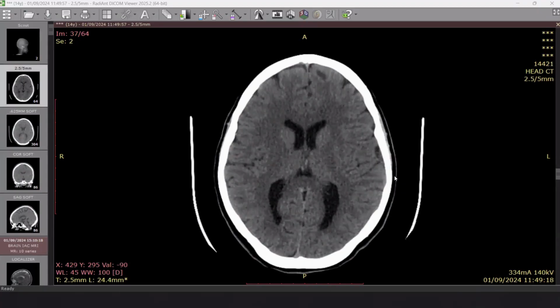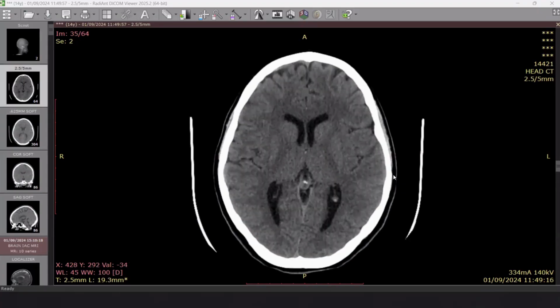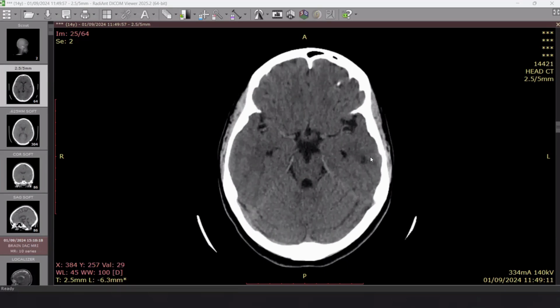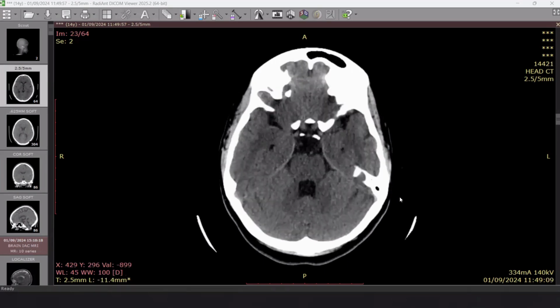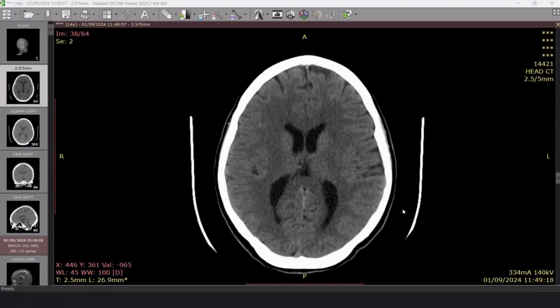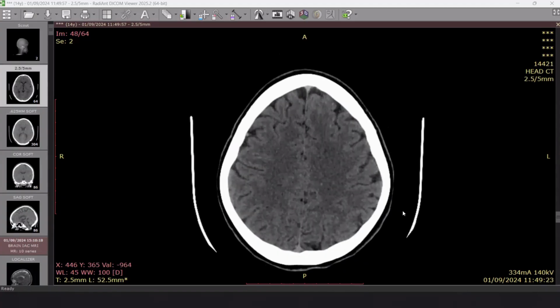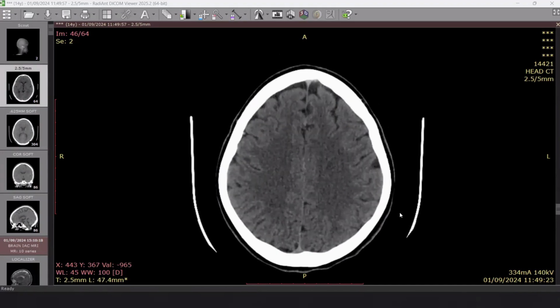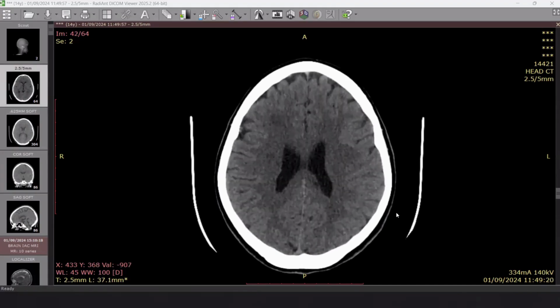But I agree with you. Well done. But do you have any more obvious abnormality? You mentioned the less obvious one, but do you have any more abnormalities? Apart from this, I want to check the limbic system as well as the insular cortex and temporal lobe.